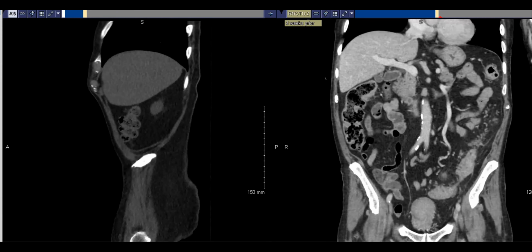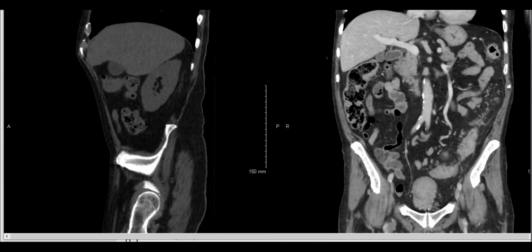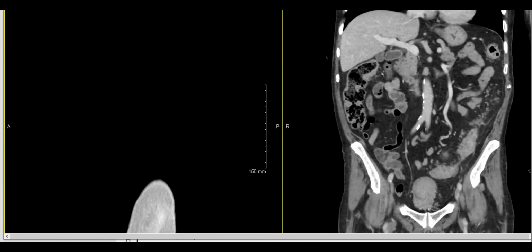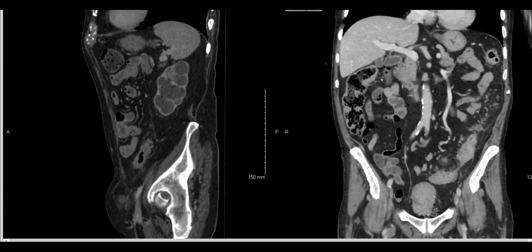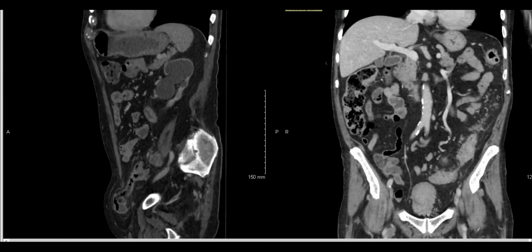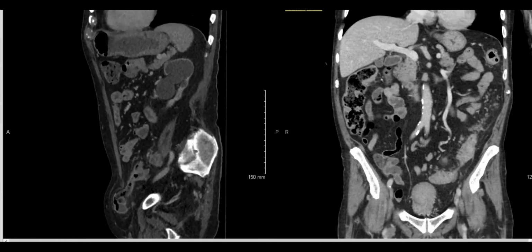I'll show you the sagittal, which is probably the most convincing. No, wait, I have to figure out the correct phase. You know how with eponyms, we'll have to call this the Chernyak hernia, I think. Look at this. Look at that. You have a diverticular abscess in your hernia. Yeah. How cool is this? This is a diverticular abscess.